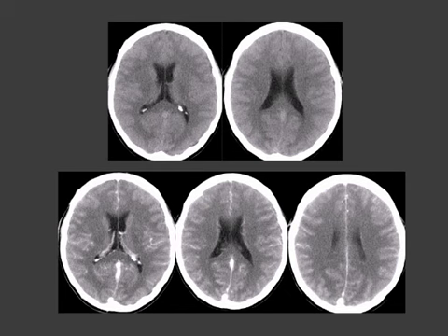This is a normal situation. Worst headache of life. The patient is 25. He's coming from emergency unit. You do non-enhanced CT, you don't see much.